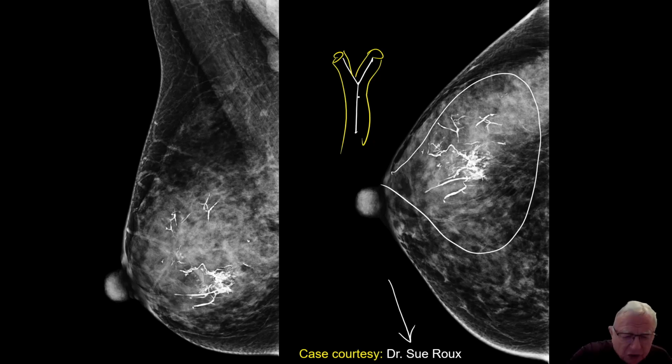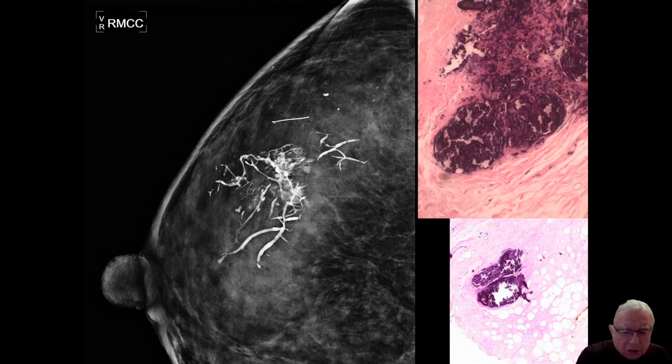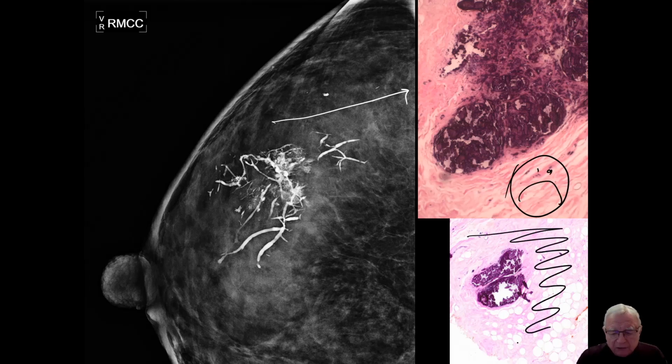It's strange, though, that the calcifications are extremely high density and even in density and smooth contoured. She's well trained, so she just does what we have to do. Prove it. And then the pathologist says, this was the most boring tissue you sent me.